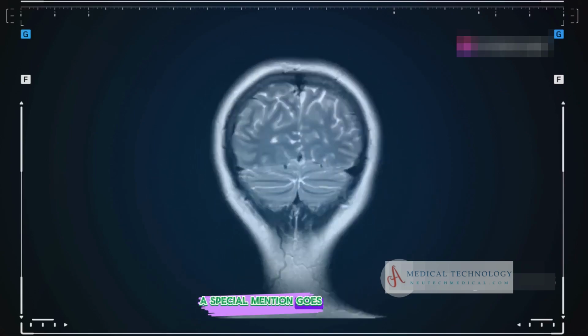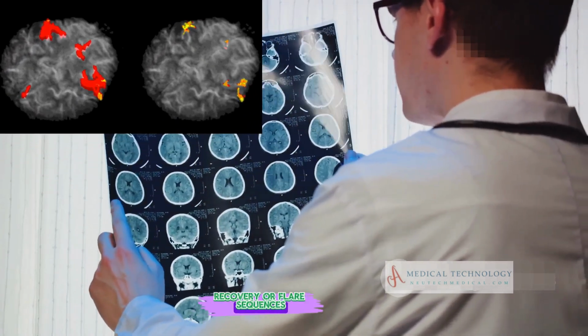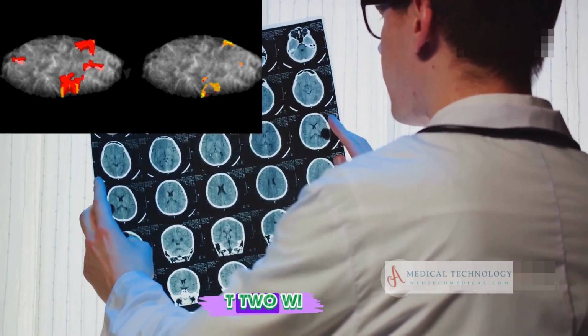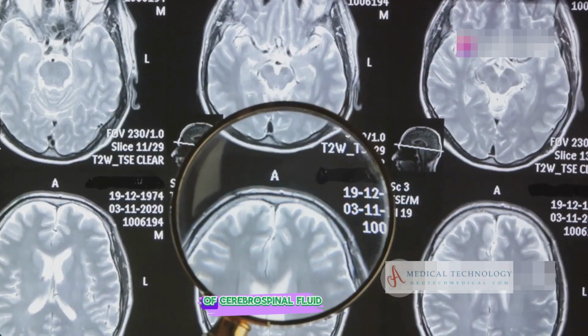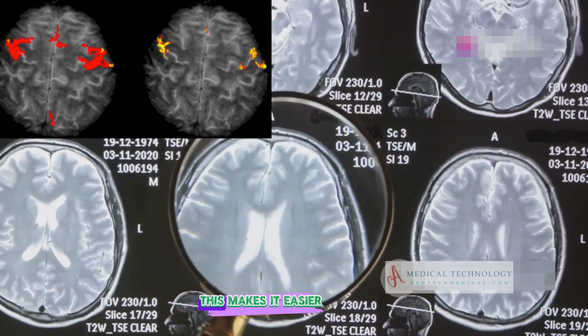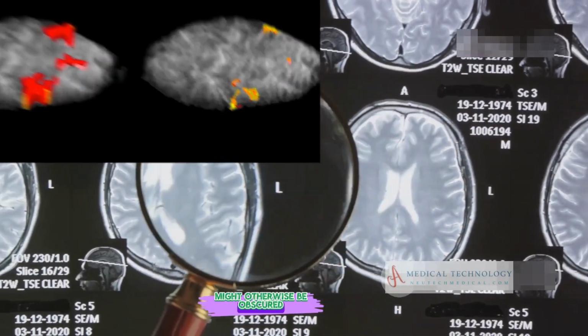A special mention goes to fluid-attenuated inversion recovery, or FLAIR sequences. FLAIR is similar to T2WI, but it has a superpower. It suppresses the appearance of cerebrospinal fluid. This makes it easier to spot abnormalities near the ventricles, which might otherwise be obscured.